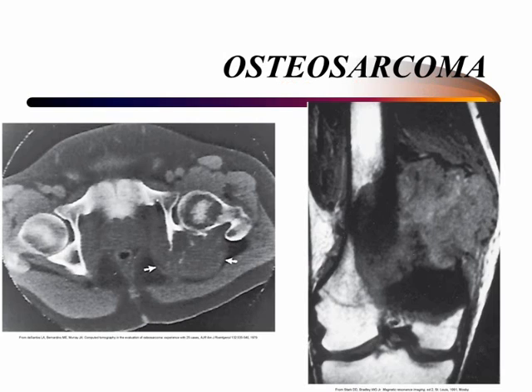In the CT axial slice through the level of the femoral head, it demonstrates destruction of the left ischium, which was seen on plain radiographs. In addition, the CT scan demonstrates a large soft tissue mass in the area covered by the gluteus maximus muscle and separated from the rectum. The mass was not clinically palpable.